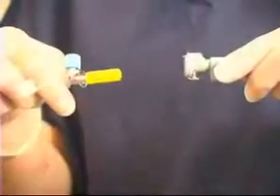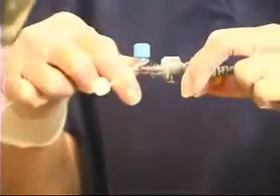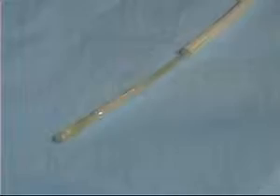When the Koala is connected to the reusable cable, a fixed volume of air is trapped in the sealed catheter microcolumn, effectively charging the sensing membrane. When the catheter is connected prior to insertion, it may trap an excessive amount of air in the sealed microcolumn and overcharge the sensing membrane. This may distort pressure sensing, resulting in high baseline readings.